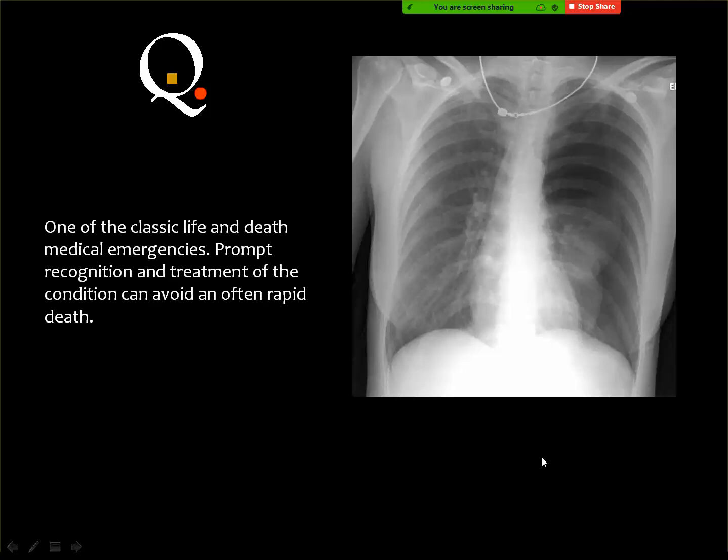Pneumothorax on the left side. Yes, a simple or tension? Simple pneumothorax. How can you differentiate between both? It is pushing of the diaphragm. Now the diaphragm is not depressed, the deep sulcus sign is not there. Okay. And the mediastinum is more or less central.